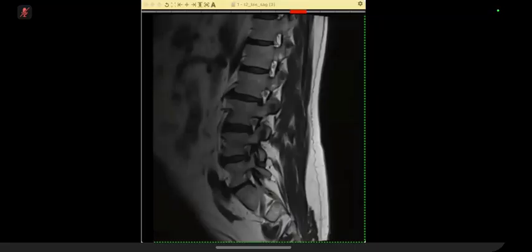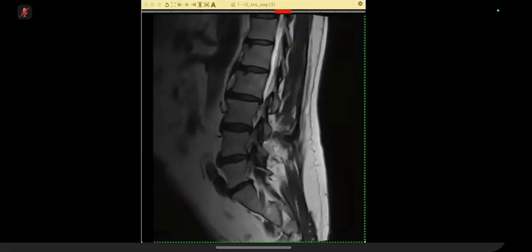So once that is done, and the neural foramen is done, remember that this is the pedicle, this is the left side, and this is the L4 level. And here, this is that classical lateral recess, and where we are, just one second actually.